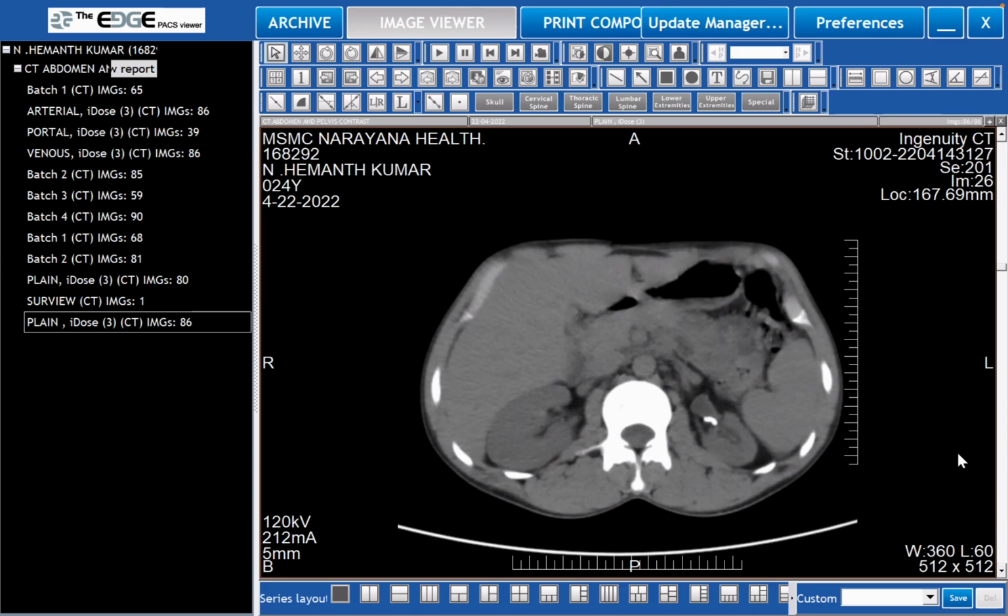A little difficult to comment, sir. No, I would say that there are no scars which are visible in this cut. But if you look at the other images, there is an extension. There is a point at which there is hardly any parenchyma. Assuming this is a stone, between the stone and the parenchyma, between the stone and the edge.